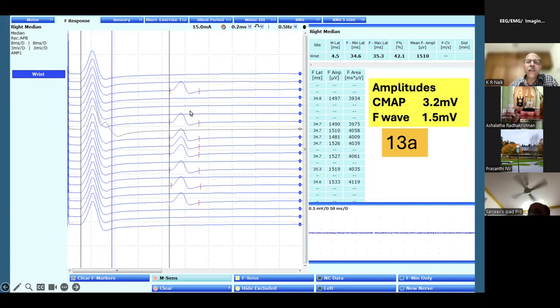In addition, you have reinnervation, which is to be identified. This is a single unit. Sometimes if there's only one motor unit, for example, in extreme patients with the late phase stages of MND, we see that M is 2 millivolts and F is also 2 millivolts. M and F will be almost identical. That is when you have only a single motor unit. Here there may be two or more motor units. So this is either axonopathy or neuronopathy with reinnervation of the one motor unit here.